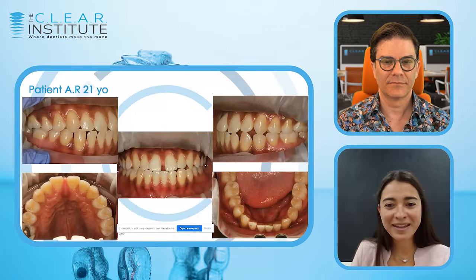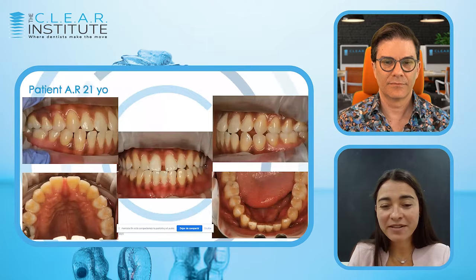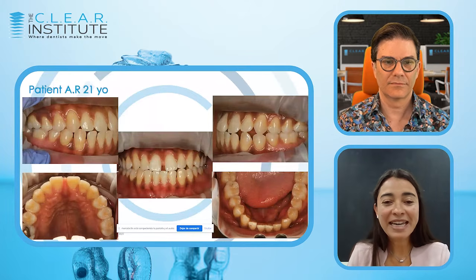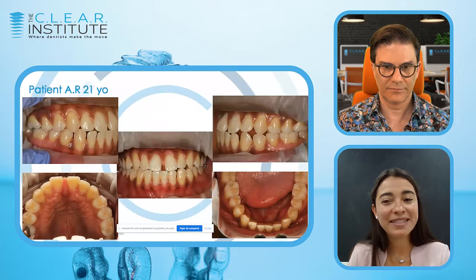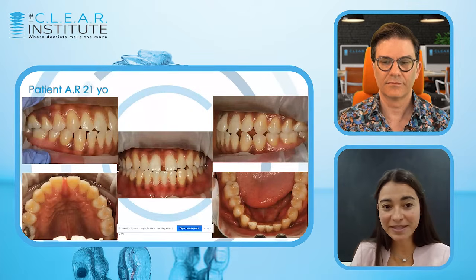So now let's look at Andrew's teeth. And what do we find here? Andrew, of course, has a very healthy periodontal condition. He has class 1 on the right side and a class 3 on the left side. This is because his mandible is deviated towards the right side.